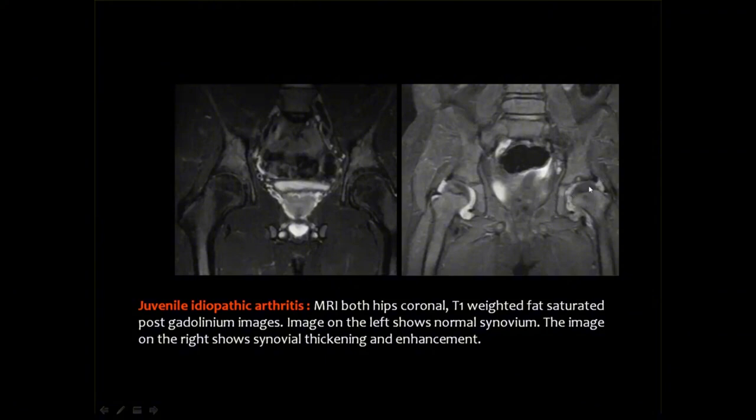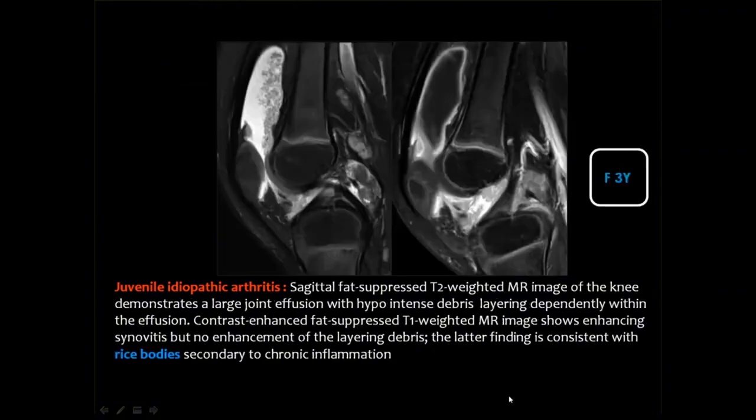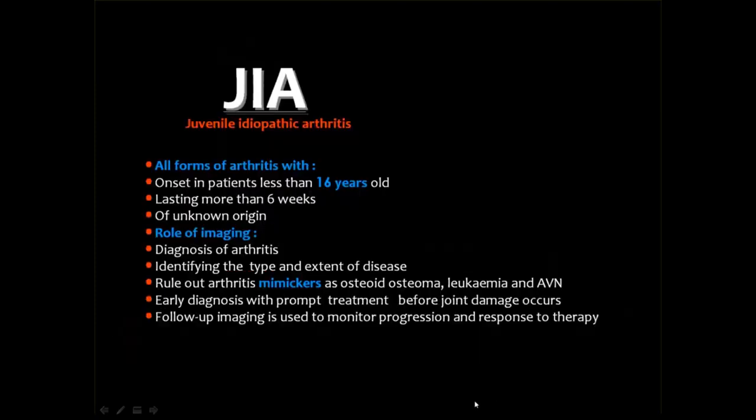In the contralateral joint you also may see some joint effusion. And you remember in the lecture of arthropathies, I mentioned that one of the features of rheumatoid arthritis in the juvenile form is the presence of rice bodies, which represent some debris inside the synovial fluid. If you inject contrast material, you can appreciate the degree of synovial thickening and enhancement.